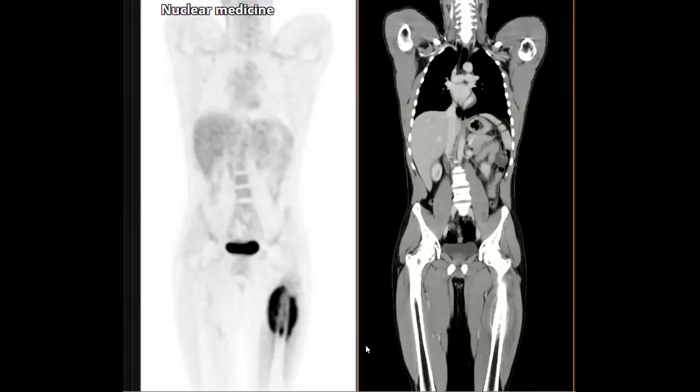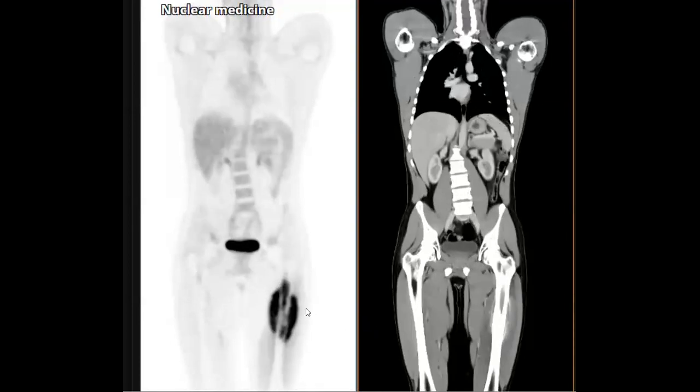It can be that this patient has intense metabolic activity along the intramedullary region, and also soft tissue and aggressive periosteal reaction. Yes, sure. But in such a case, we think about a neoplastic lesion in the bone, and it comes in the diaphysis. In such a case, we think about either osteosarcoma, which is more common in the metaphysis, right? Especially the distal femur. But if you find it diaphyseal, as you mentioned, we think about something like Ewing sarcoma.